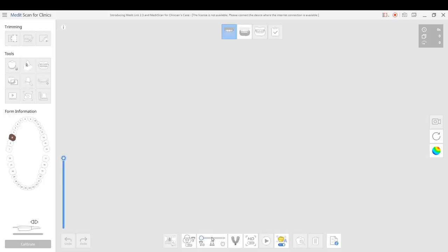New users would be just the opposite. They want to have a low filter setting. They want to pick up as little data as possible because they're not experienced enough yet to control all the moving parts that may hamper you. So a lot of great features. You'll see clinical examples of that throughout this presentation. From there, we'll move on to the new metal scan mode. You'll see some features of that.